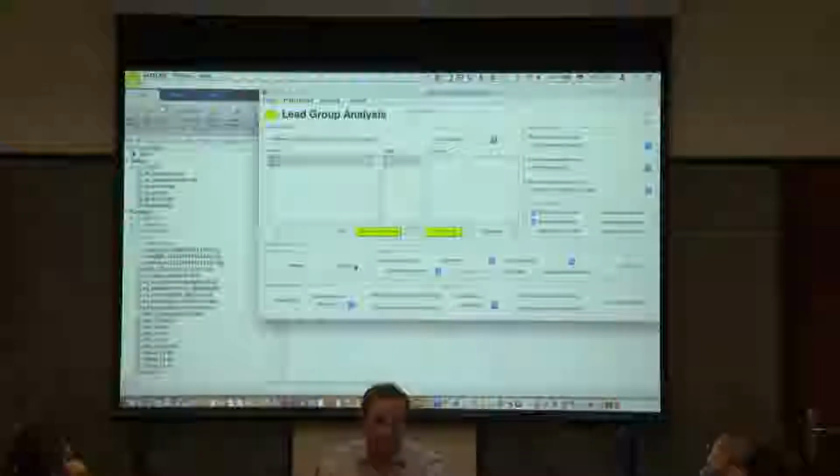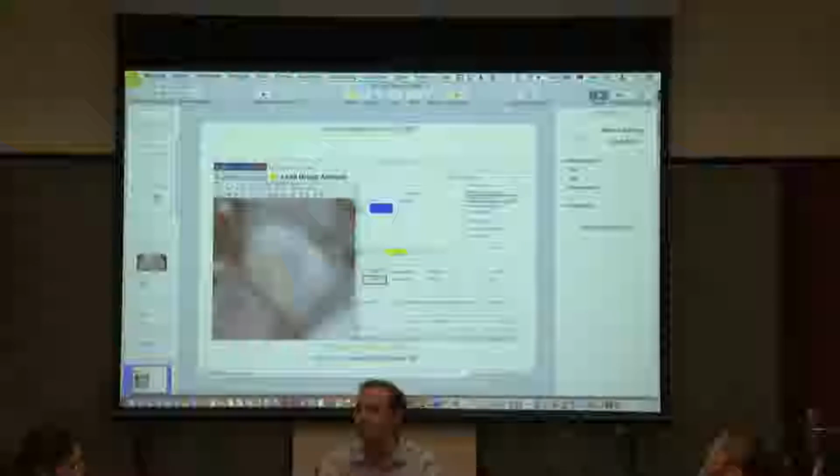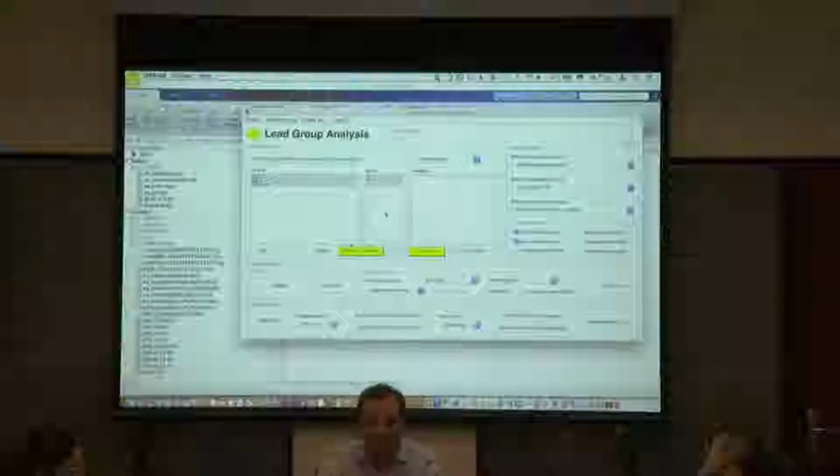But the idea here, and if you need it, it is actually working, is to create these two-dimensional slices where you see all of the contacts, and it will basically create one for each contact pair. It's also not often so important. Okay, so this doesn't work currently, but we'll fix it. Now we know. Now we just need time.